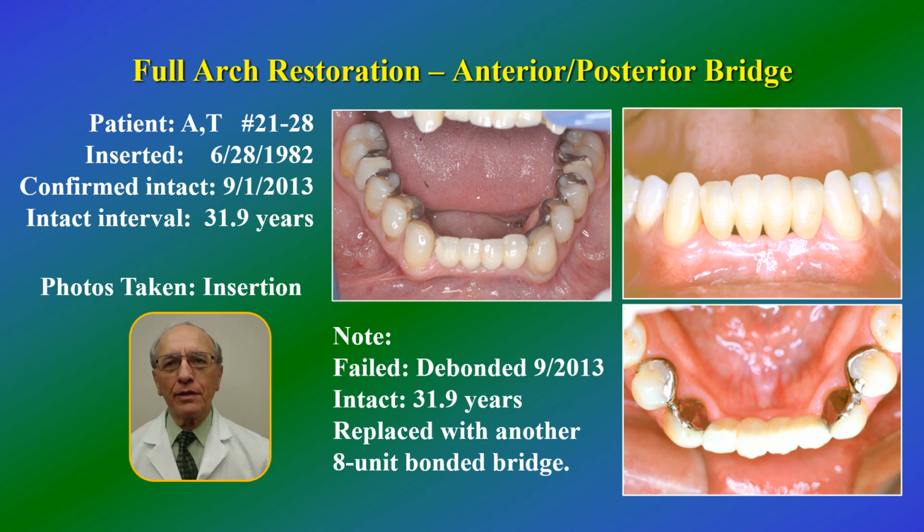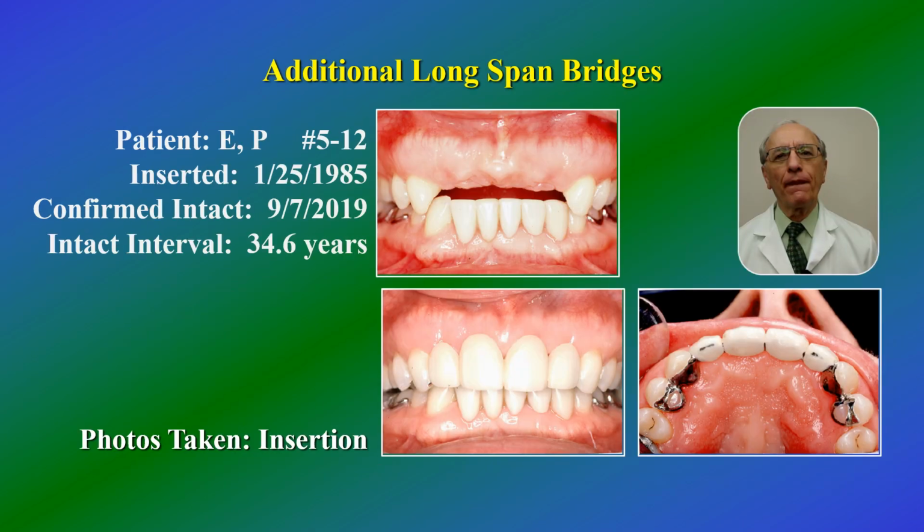So you do not think this is a rare exception with such a long pontic segment, the following examples may be more convincing. This 4-tooth span is even longer than on the mandibular arch. The bridge is in normal occlusion and not protected by creating an open bite. This bridge was intact for over 36 years when it failed due to a problem with one of the abutment teeth. The specific problem was not known. Note the open areas on the framework over the lingual cusps. This case is described in more detail in another segment.